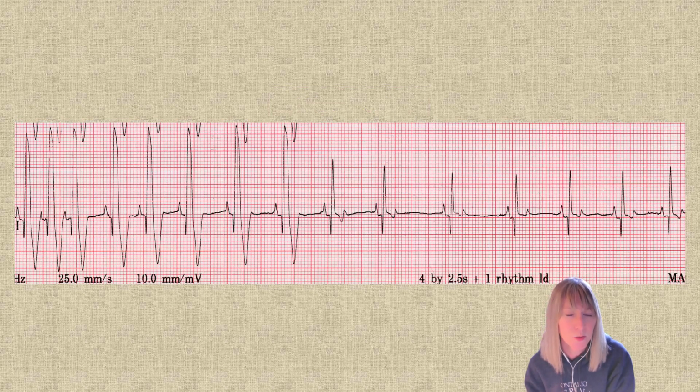Okay, lastly, this is an ECG from a Doberman pinscher. Really cool. Towards the right-hand side of the page, I have a heart rate that's about 100 beats per minute. Towards the left-hand side of this trace, so away from me, is at the beginning, maybe more like 190. But as I look at every QRS complex across this trace, whether it looks wide and bizarre like it does at the beginning, or more narrow and normal towards the latter half, there is a P wave in front of every single one of those QRS complexes at roughly the same distance.